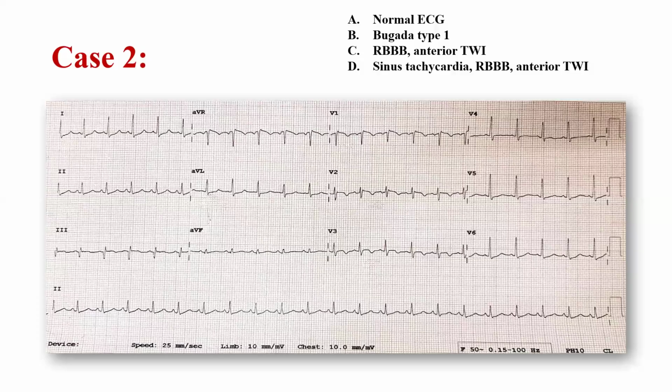Also there is ST elevation in lead V1. So it looks like a coved pattern like Brugada. My differential diagnosis is Brugada syndrome, as in V1 it is a kind of ST elevation in a coved pattern. Okay, I agree with Dr. Abdullah Al Mamun, sir. Rightly mentioned, it's not typical of RBBB pattern, and also we have to look at the clinical history background.